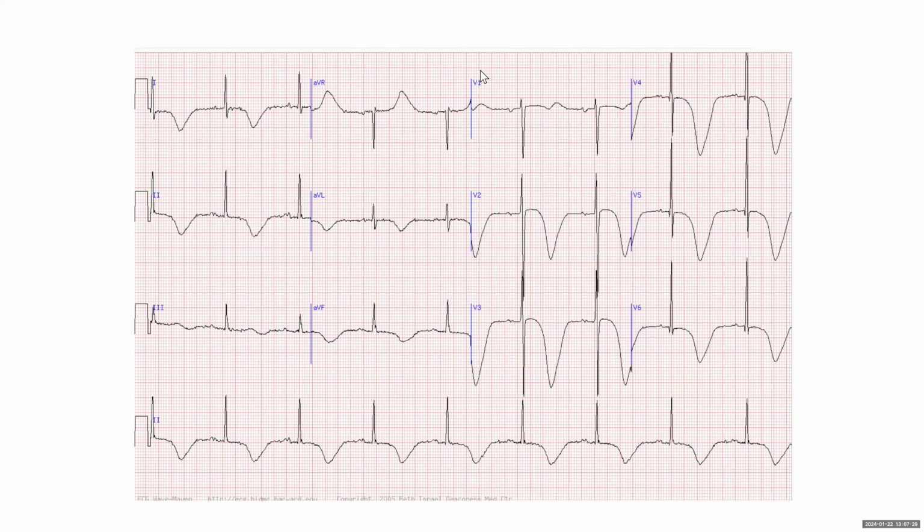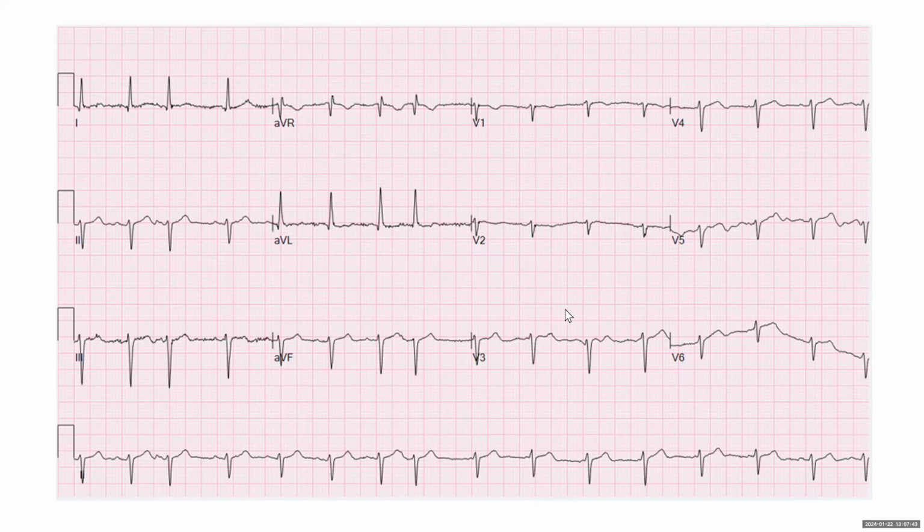Yeah, Yazid is correct. More than 10 millimeter, correct. So when the amplitude is more than 10 millimeter, we call it giant. So this is a code, not a common ECG finding. So I just wanted to make sure you know about this. Okay, excellent. What about this one?